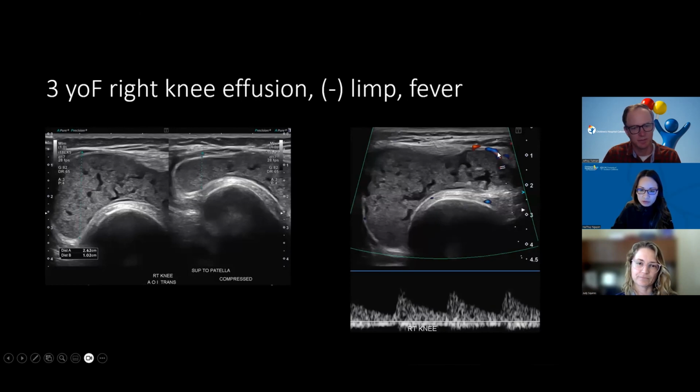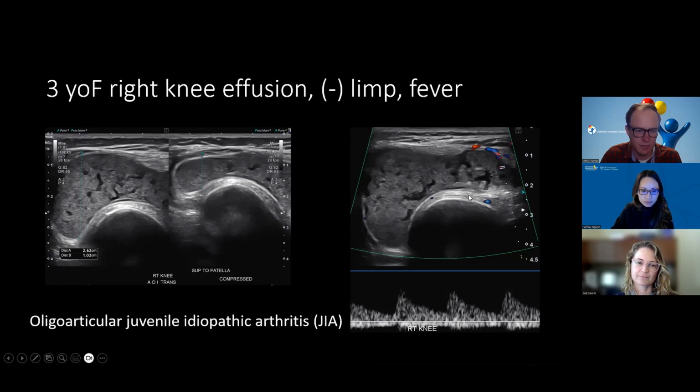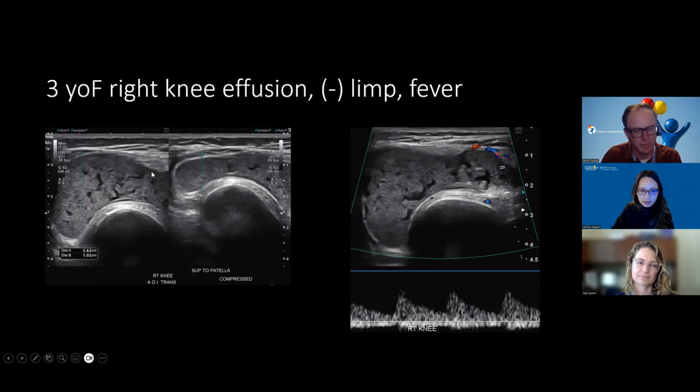So maybe there's a little bit of synovial thickening or reaction, or maybe just a normal blood flow to that area. But because of these findings, I did mention that these are likely to be rice bodies, which was weird because the ED physician said this has been ongoing for a while, doesn't really cause her any issues, no other findings of inflammatory changes or anything like that.